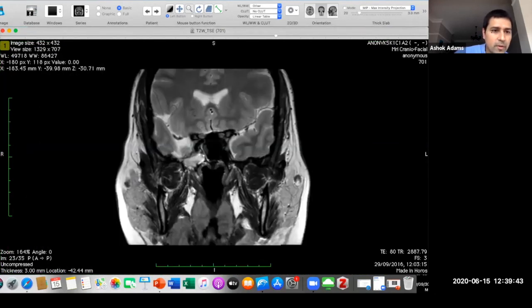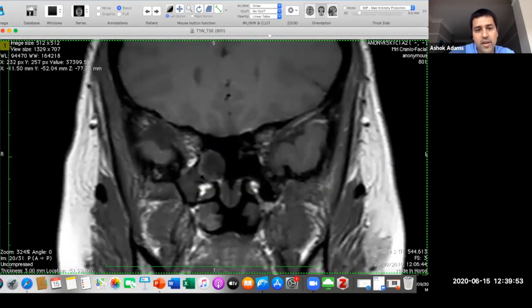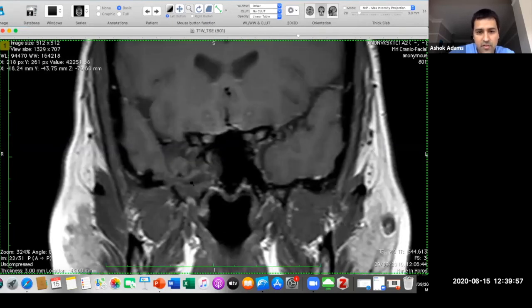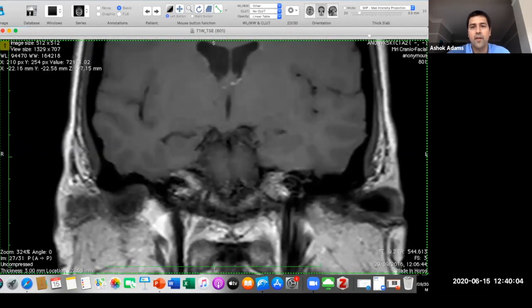Again, if you want to be entirely definitive for your surgeon as to whether it's just a meningocele, where it's just the meningeal layers that you see, or an encephalocele, when you start to have brain tissue that herniates through. So you can see here, normal temporal lobe here, and here you can see some of that temporal lobe has been sucked in. You've got brain tissue that's gone through that skull base defect. Okay, so that was all from a unilateral opacified sphenoid on that first CT.